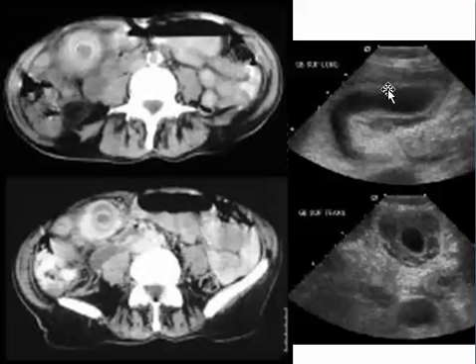What is this? A big or large gallbladder with pericholecystic edema, and it appears enhancing because of the inflammatory process.